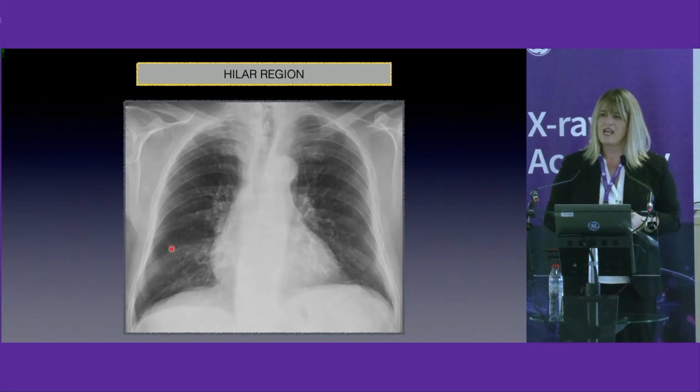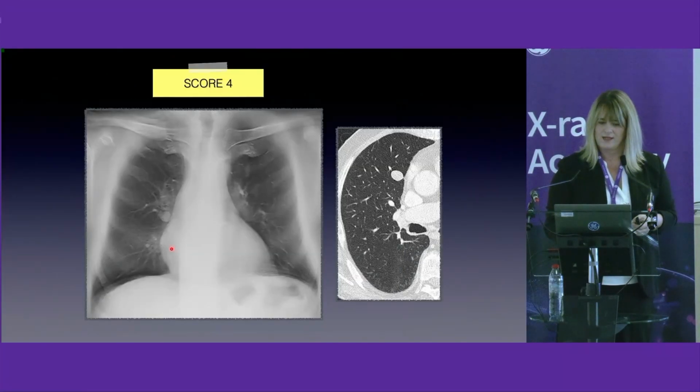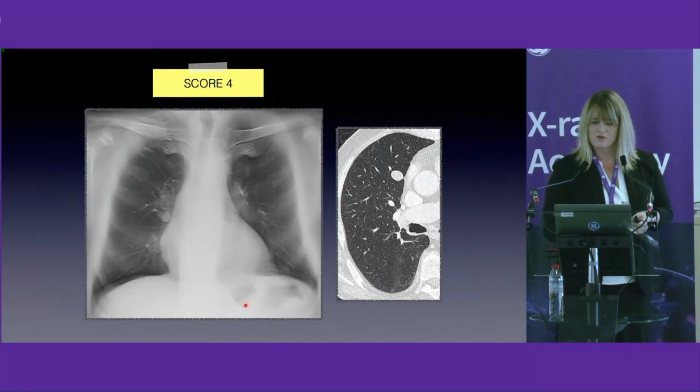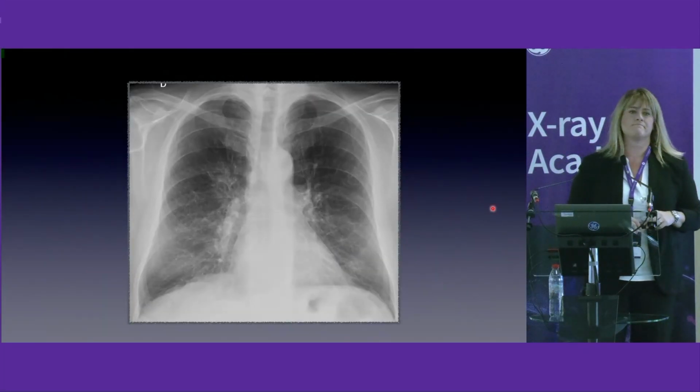We can see an opacity of the right hilum. Take a look at this. So nice, it's a nodule which was confirmed by CT scan. It's a very difficult case, this one. Yes, I know. And what about this?